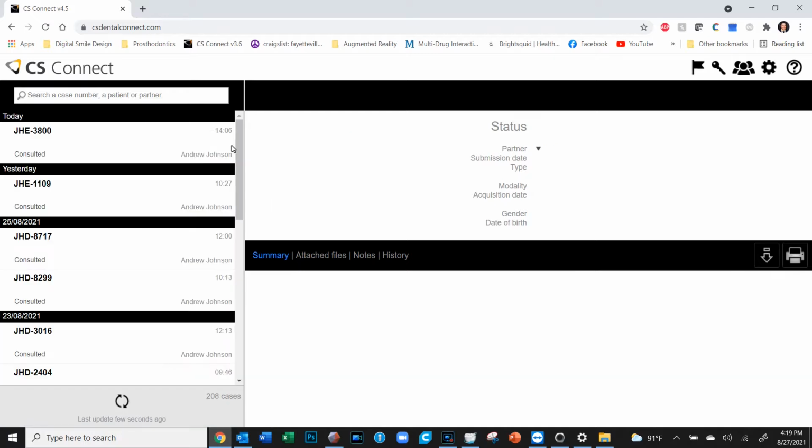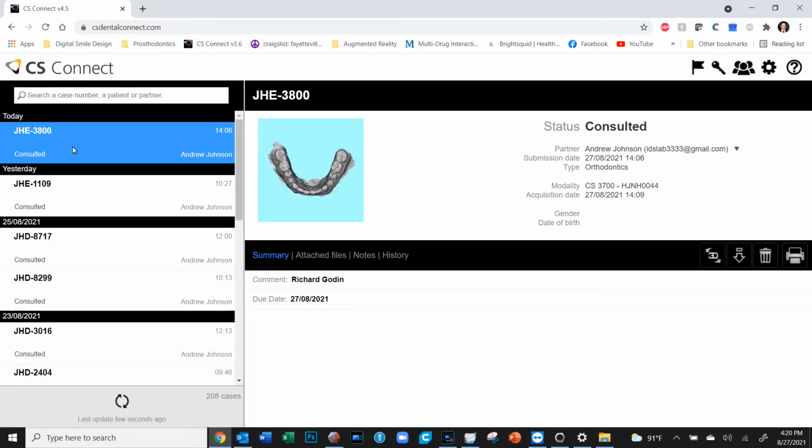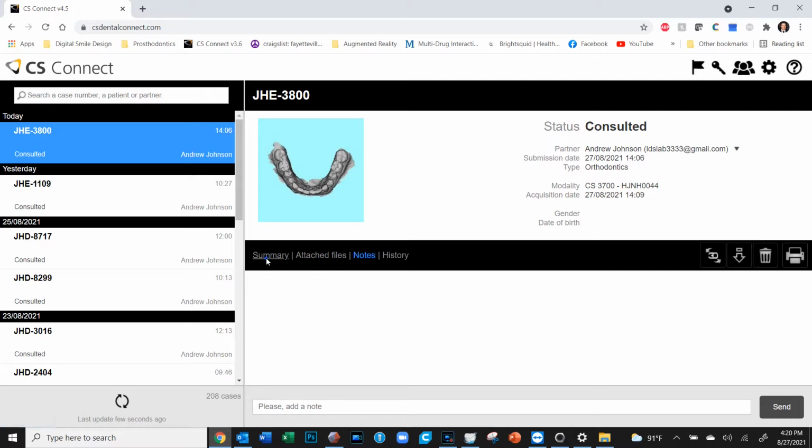And we should see a whole list of recent scans, the most recent being at the top. And they're organized by date. The names don't appear over here, but sometimes they do appear in the comments or the notes section here.